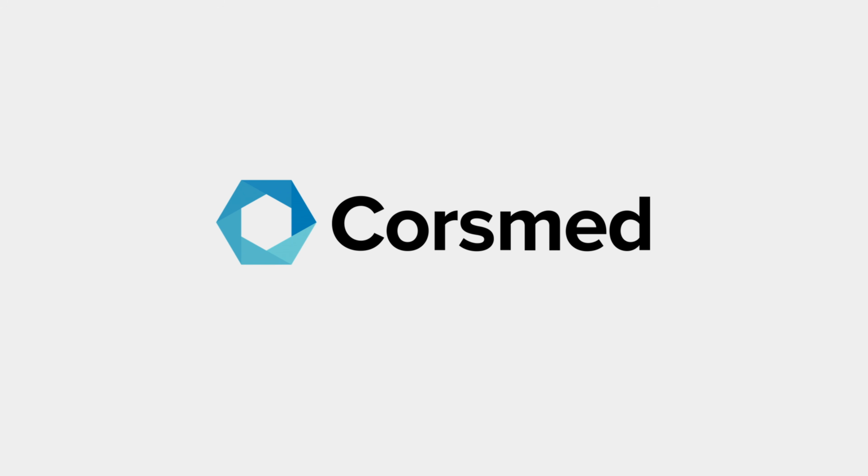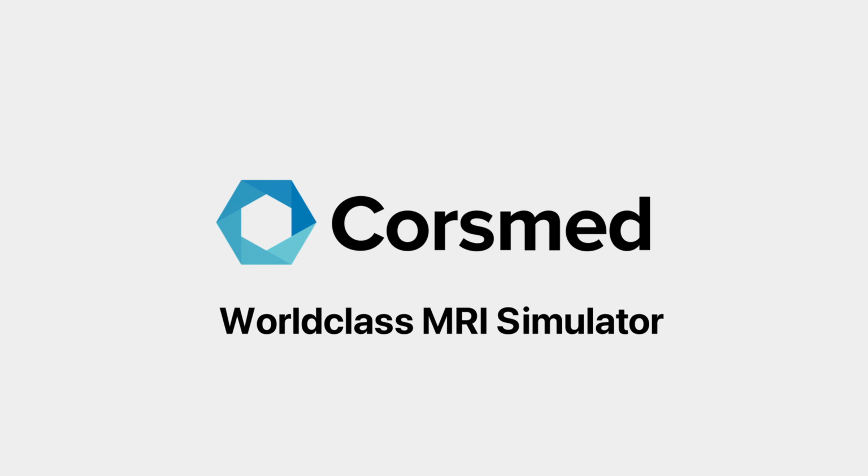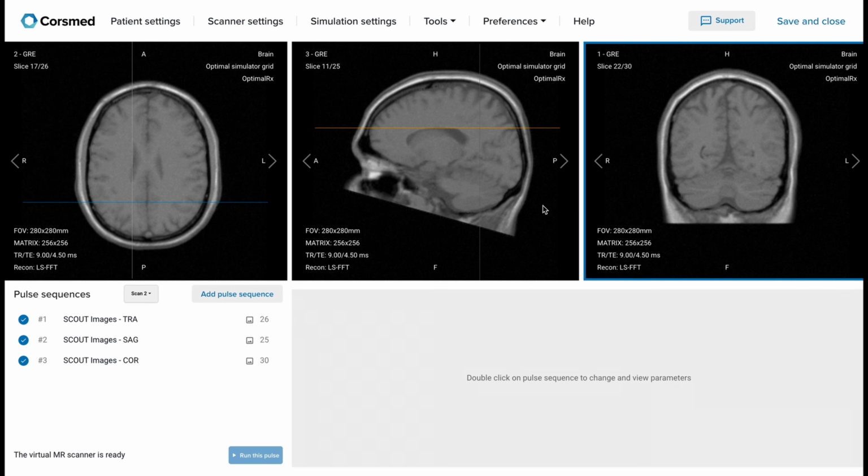Today we're going to do the routine brain MRI, one of the most common scans in the entire world. We're going to do this step by step and make sure you get every step and every image with high quality. I'm going to swap over to the Corsmed MRI simulator, so let's get started. Here is the Corsmed MRI simulator, which is where I will show how to run the protocol.